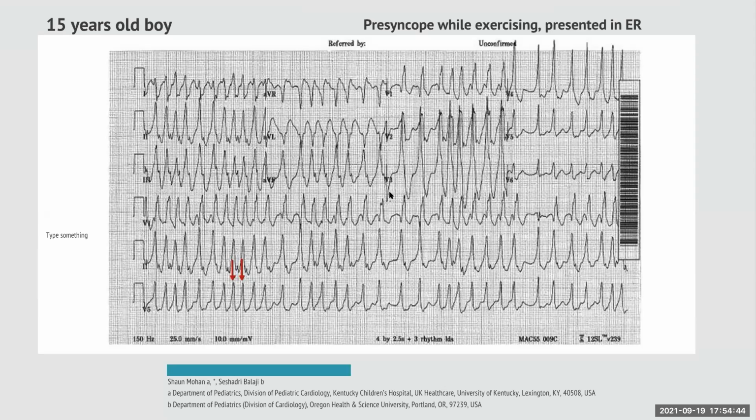But there is something in this one as well. Can you see any P waves here? Look at lead V1. Exactly. I can't find any P waves. Very good, excellent. So you cannot find any P waves. That's beautiful. Look at the QRS. How does the QRS look like? Is it a broad complex or narrow, less than 0.12 seconds?